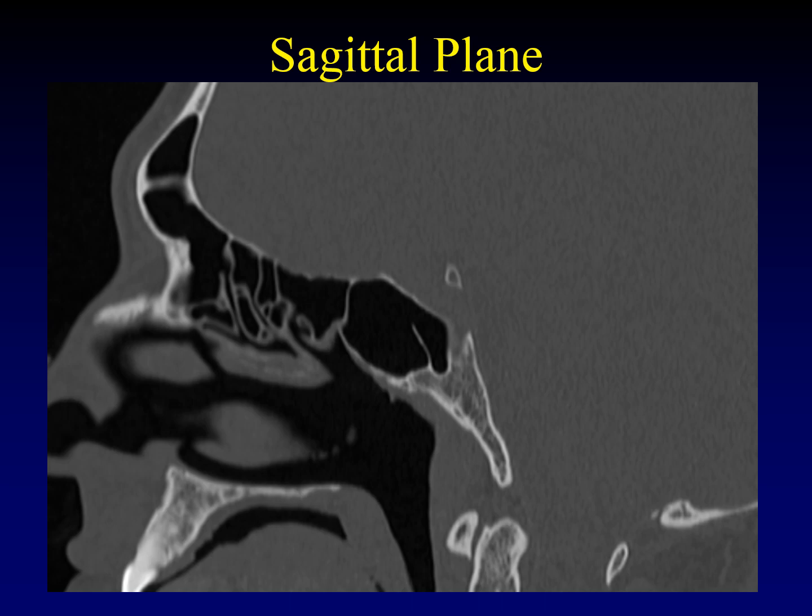The sagittal plane is extremely useful when analyzing the paranasal sinuses. We could have an entire hour-long lecture on subtle uses of the sagittal plane. I'm just going to throw a couple of things out here. The frontal nasal recess is often really well depicted in the sagittal plane, draining the frontal sinus down into the middle meatus.